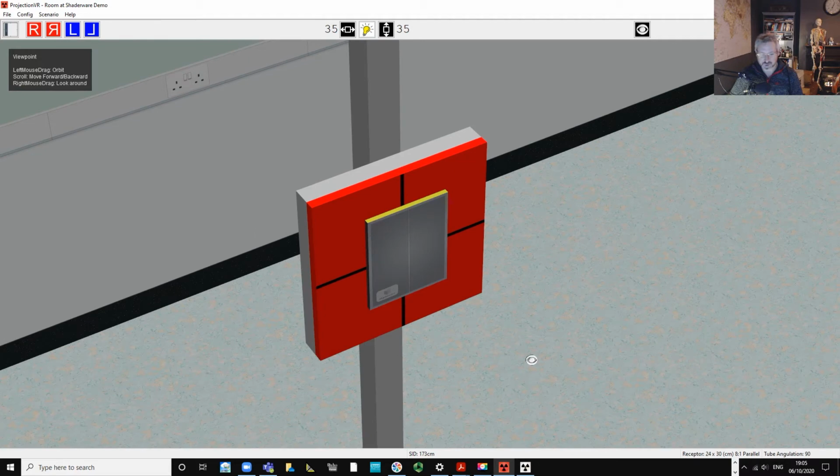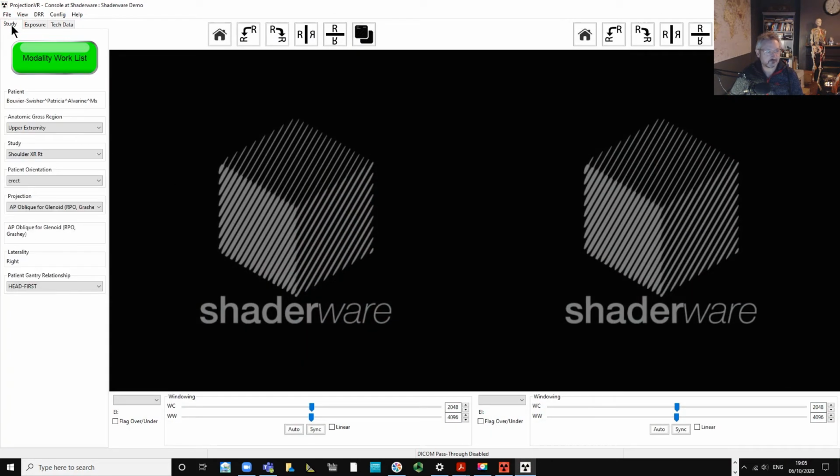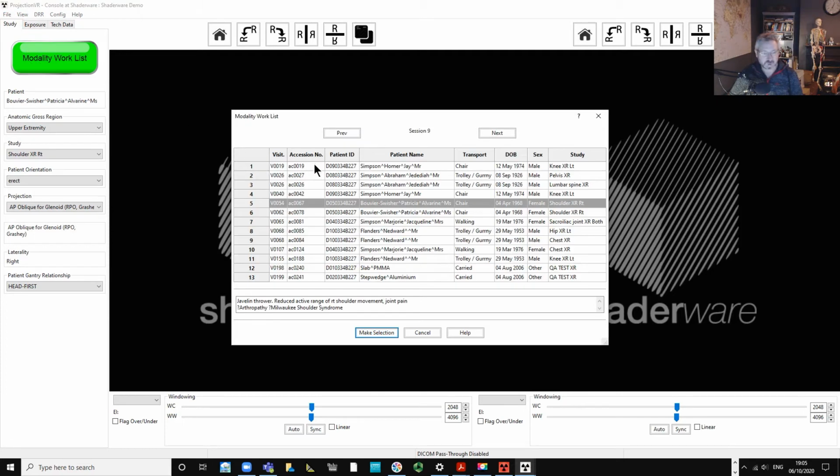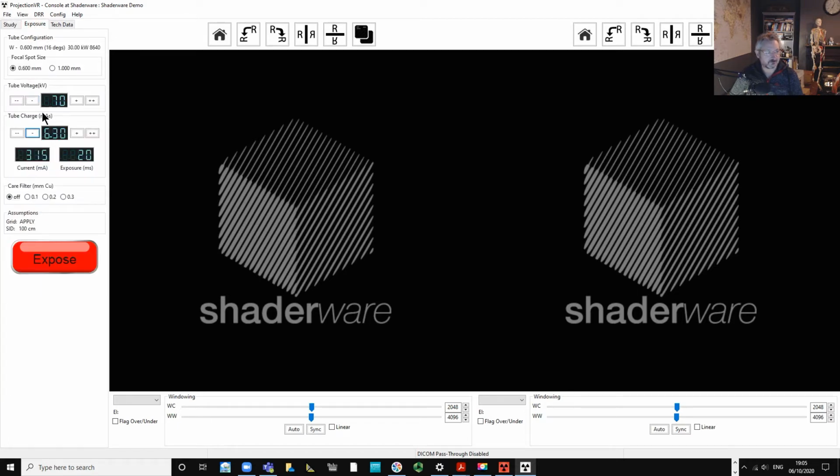Now, was it the right shoulder or the left shoulder? Can't remember. Go into the study tab. So yeah, it's a right shoulder. So I have to go back through all this again now. Always good to have a good memory. So 64, 64, and 4.